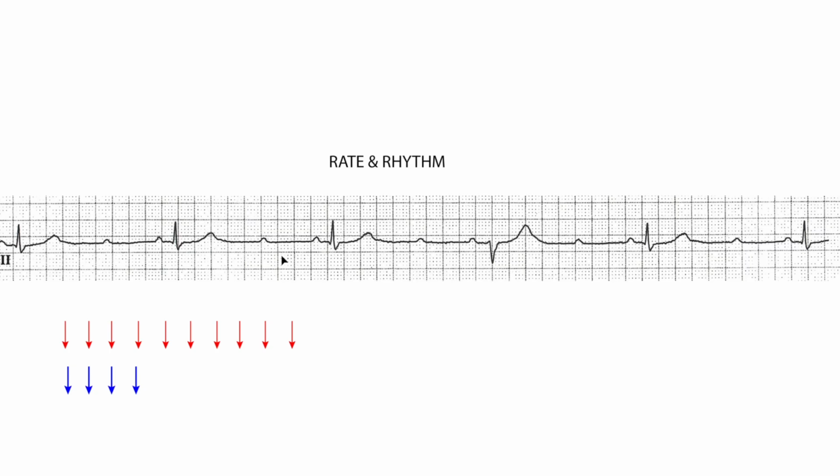Okie dokie. So, first thing that really stands out is we have a very slow ventricular response with basically gaps with these little bumps on there, which I'm assuming are P waves. So I'm just going to start throwing arrows up on them wherever I see them. So there's a bunch of these, right? And there seems to be 2 of these bumps. And then we get a QRS.